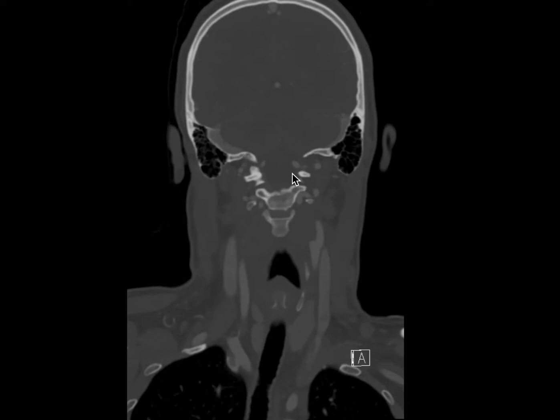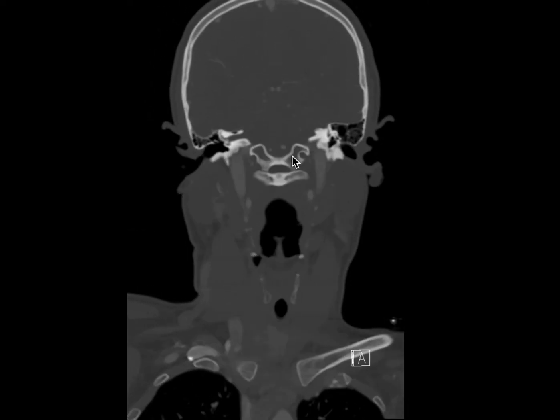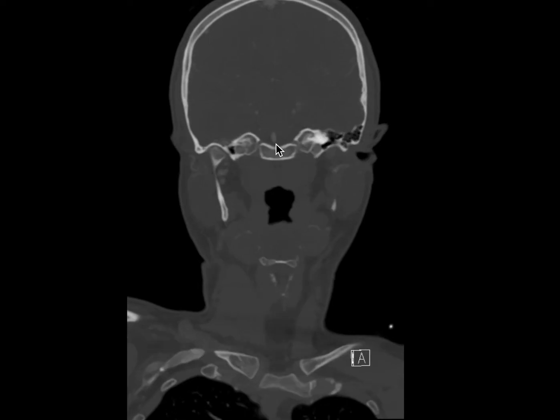Now going anteriorly again, we're going to see it enter the dura to become the V4 intradural or intracranial segment, until at this point it merges with the right vertebral artery and becomes the basilar artery.